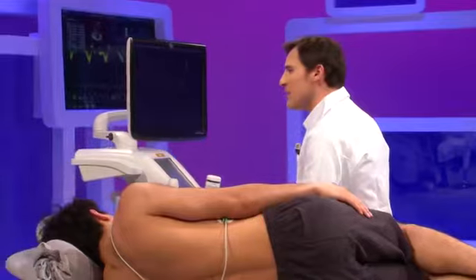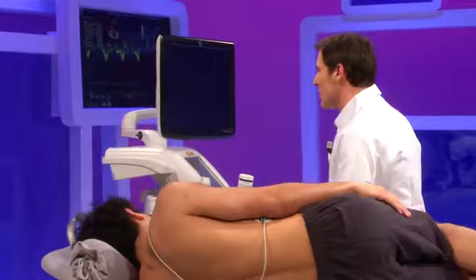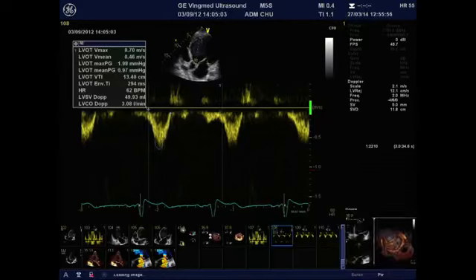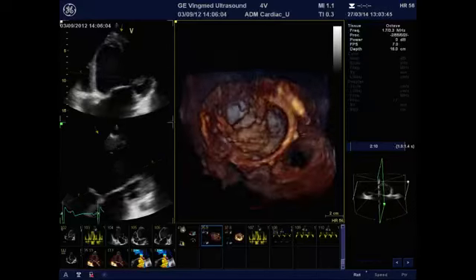So in other words, if I have to conclude, I would say that we have a patient with severe mitral regurg that is secondary, due to a significant remodeling of the left ventricle and significant changes in the mitral valve deformation. Just to illustrate the effect of the remodeling process on mitral regurgitation, it is of interest to use 3D echocardiography. Even if it's not the scope of the presentation, this is just to show you exactly the impact of the remodeling process on the mitral valve leaflet.